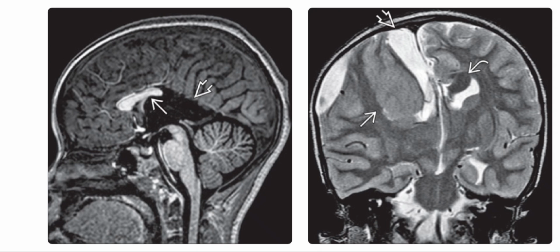The image on the left is the sagittal T1-weighted MRI, and it shows partial agenesis or dysgenesis of the corpus callosum, whatever you want to call it, agenesis or dysgenesis. The posterior portion of the corpus callosum is missing, but the junction with the fornix seems preserved. The posterior coronals would show Probst bundles, whereas the anterior images would appear normal.